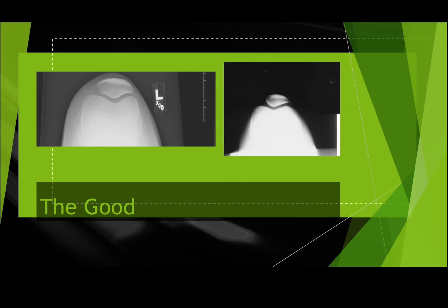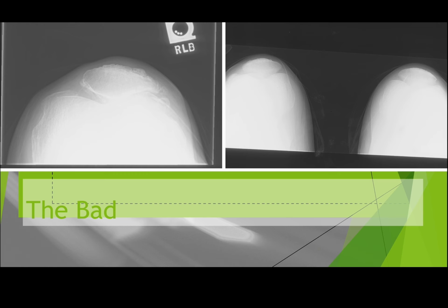So here's our good one. We see that the patella is nice and good in profile, and we see that nice open space. And here are our bad ones. You see that there's not really much open space of the joints. The images are not very clear. It could be due to lack of angulation. Maybe some technique factors are involved in here. I think that very first one might have to do with some pathology, as it looks like there's some ridges on the top of the patella. So that could be pathology related.